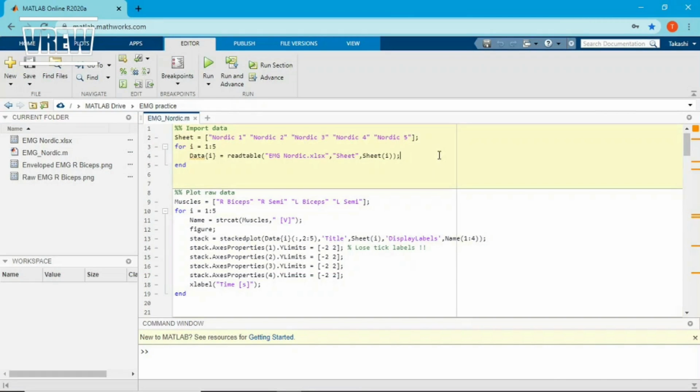Okay, Matlab. First of all, I have to import the data. The data is on my local computer, and I just imported it into Matlab in Excel format. Pretty much, they said the software Pro EMG can provide EMG data in kind of any format. It could be CSV, Excel file. You just export it and download it, send it to whatever, like a USB or cloud, and you just download it onto your local laptop device. Then you just import.